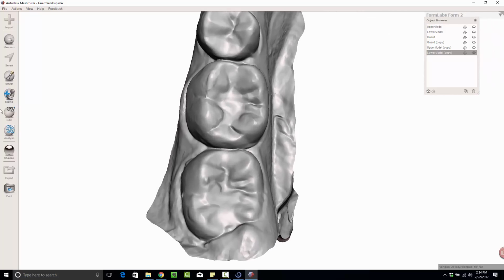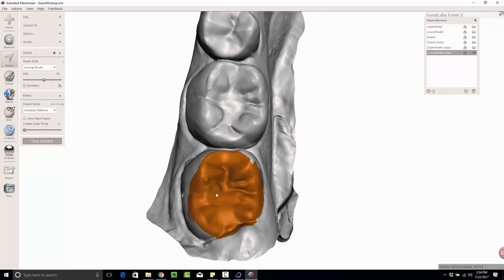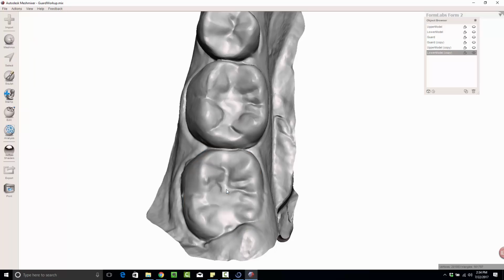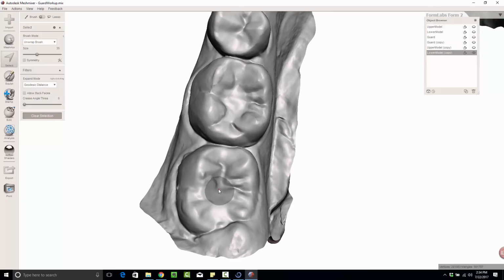So first of all, we're going to use the select button again. And you see how it starts off with this big area. That's the affected area. Well, that's too much. We're not looking to do that. So instead, I'm going to hit Escape, hit S again, and start over. You can slide this little bar left and right to get it bigger or smaller, or you can use your bracket buttons to make it bigger or smaller. And there is no right number. It's just about what you feel works.